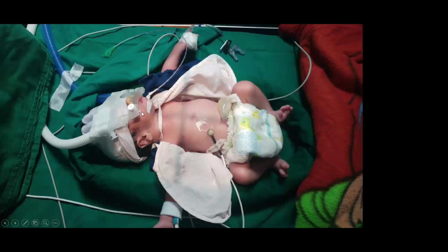If you want to take the neck, perfectly fine. If you don't want to take it, then the upper margin should stay somewhere where the neck starts, because you would like to see the pathology in the spine also. So from where the neck starts till the upper 1/3 for the chest X-ray.